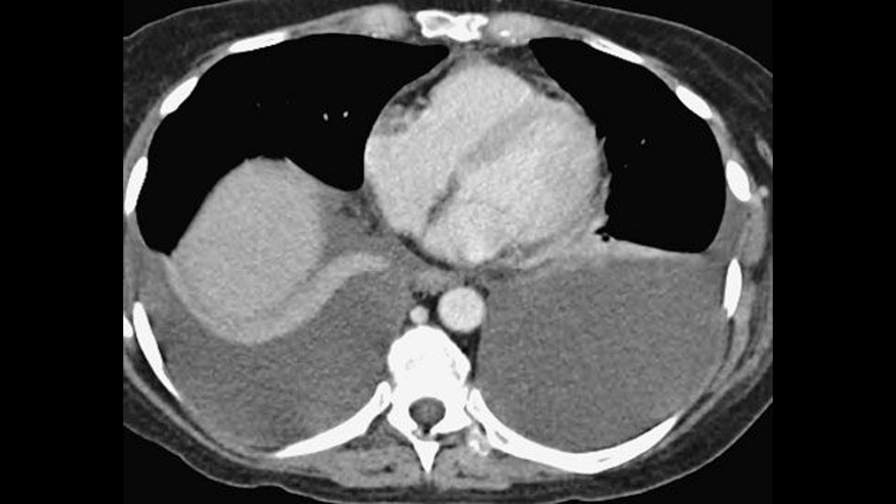Another subtle feature is the loss of visualization of the pulmonary vessels beneath the dome of the diaphragm. On the lateral projection, there is typically blunting of the posterior sulci, a horizontal or flattened contour of the diaphragm, and sometimes a tongue of fluid extending along the major fissure, known as the thorn sign. A subpulmonic effusion can easily mimic an elevated hemidiaphragm or small lung volumes, so awareness of these features is essential.